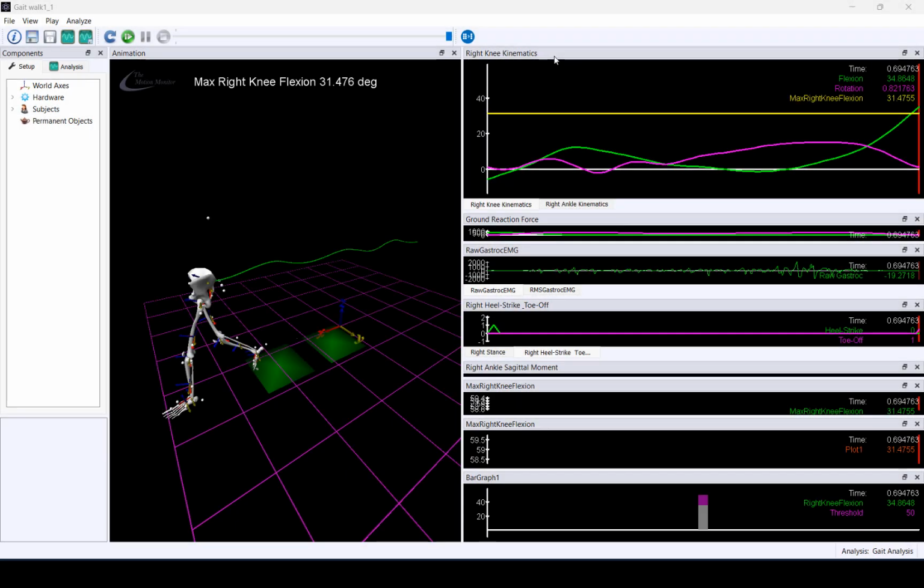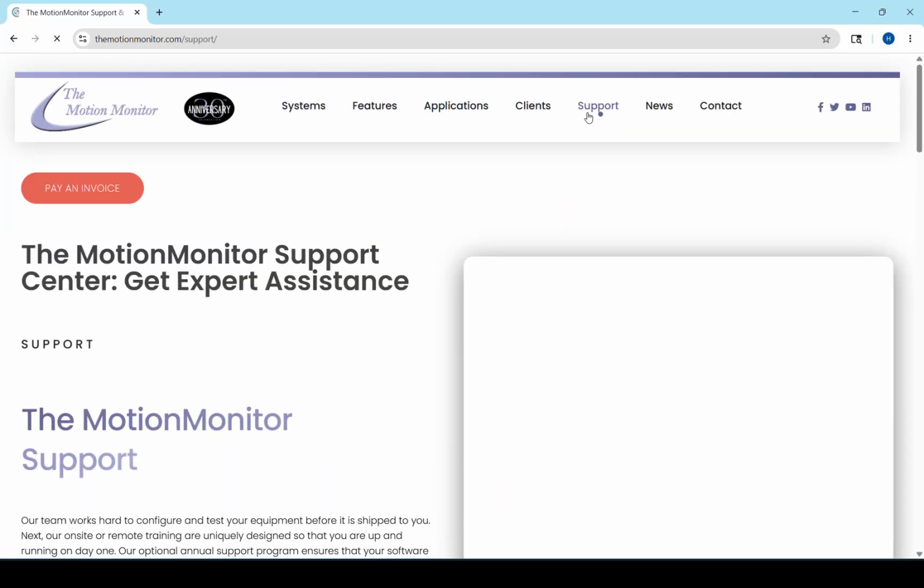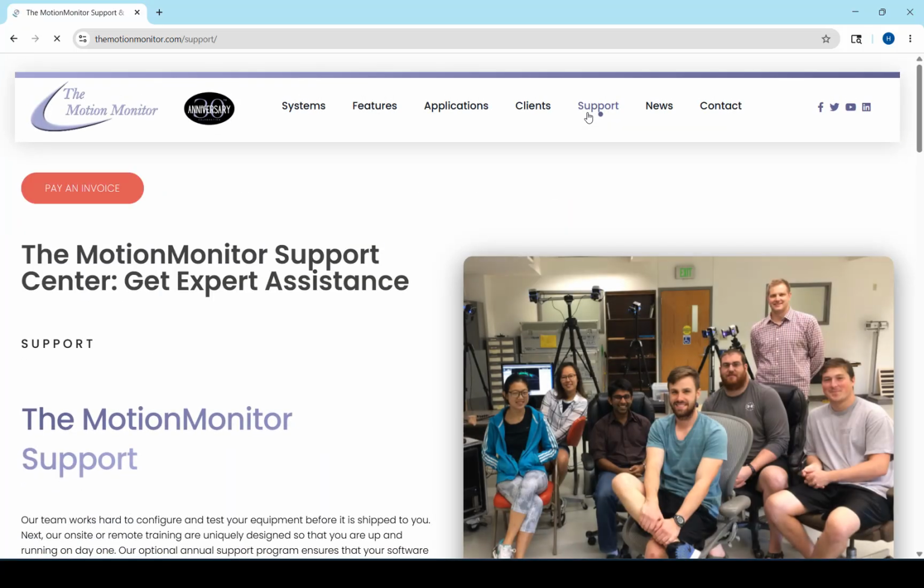We've covered a lot in this training session, and we hope that you can look back on this video as a helpful resource as you begin using the MotionMonitor xGen. Along with this video, you can also find a complete list of the MotionMonitor resources on our website, www.themotionmonitor.com. Once there, you can navigate to the support page. Here, I'll point out a few additional resources for you.